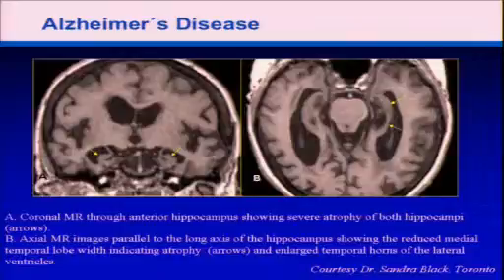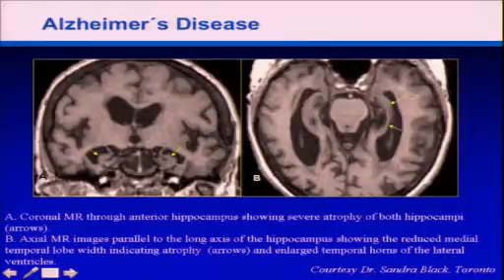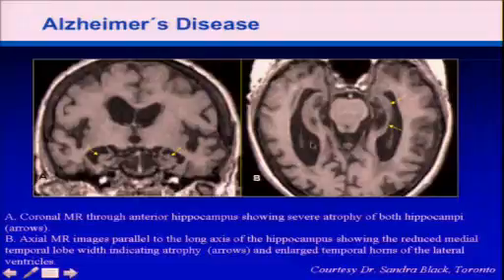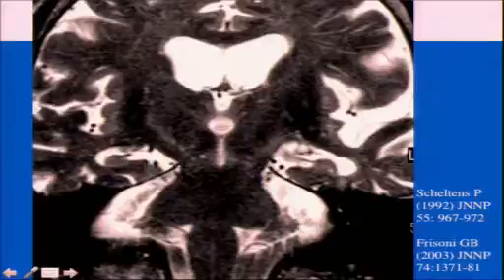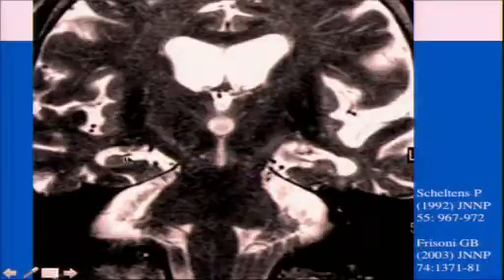That's where the atrophy also starts. We can try to quantify that. There are different methods that have been described, like here by a group in Toronto, where we can measure the thickness of the medial aspects of the temporal lobe. But what is done today more and more is that we look on coronal and 3D scans, and we see whether there's more pronounced atrophy at the temporal horns of the lateral ventricles compared to the general ventricular size.